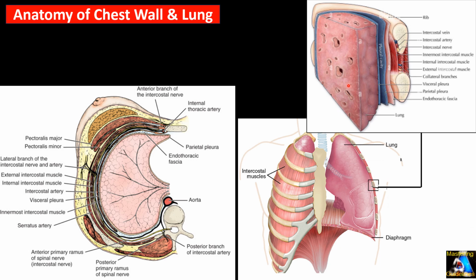give us any information. In fact, the ultrasound of the lung has a very important feature, and that is artifact, that we use for detecting important pathology of the lung, including pneumothorax, pleurisy, pulmonary edema, pneumonia, and interstitial edema, or some of the respiratory syndrome.